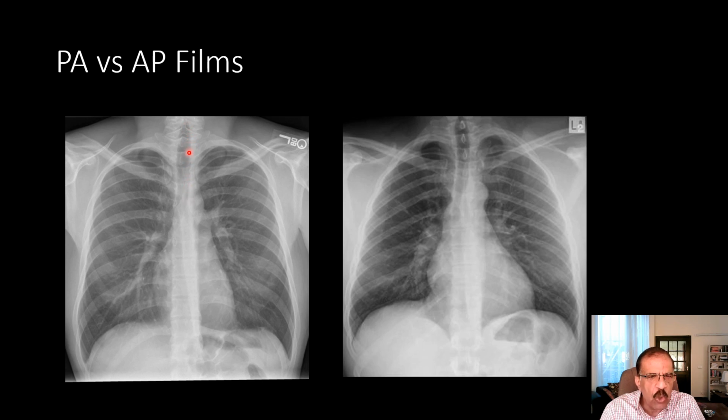Now this is blackish. This is the trachea. You can see the normal size, and at this point it bifurcates into the left main bronchus and the right main bronchus. It is more obvious here. This is the point where it bifurcates. This is called the carina. You can see the left bronchus and the right bronchus. The right bronchus is somewhat straighter. The left bronchus is at a little more of an angle. That is why when somebody ingests a foreign body, it is more likely to go to the right side.